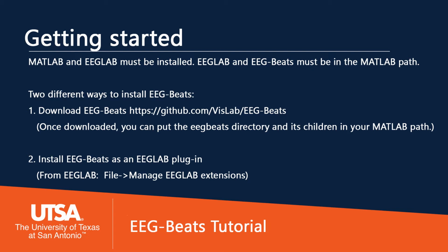There are two ways to install EEG Beats. You can either download it from GitHub or install EEG Beats as a plugin through EEG Lab. In this video, I'm going to demonstrate how to use EEG Beats through EEG Lab.